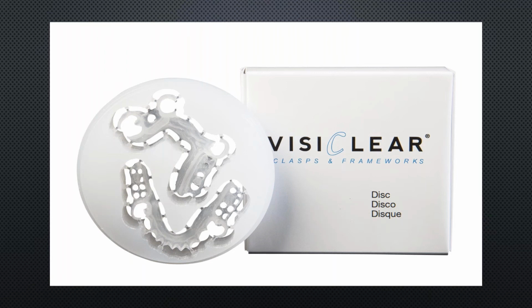And so with the VisiClear, it has a little haze to it, and that haze kind of shuts down that transition of light. And actually, whatever it's sitting on, it absorbs. So if it's sitting on tooth structure, it'll absorb that and become that color. If it's sitting on tissue color, it'll absorb that and become that color. So it's actually a much better option. It's a little bit of a struggle when talking to a doctor.